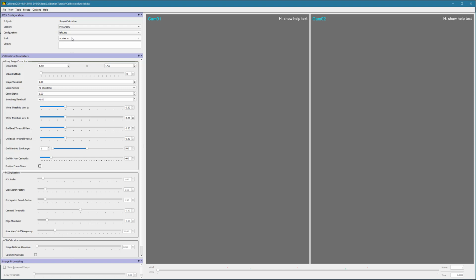It is at this point, before any trials are selected for correction, that we need to specify the final dimensions of the corrected images. Determining the optimal resolution of the corrected images is beyond the scope of this tutorial, but it depends on several factors, including the bones being tracked and the resolution of the CT or MR images used to construct the 3D bone models.